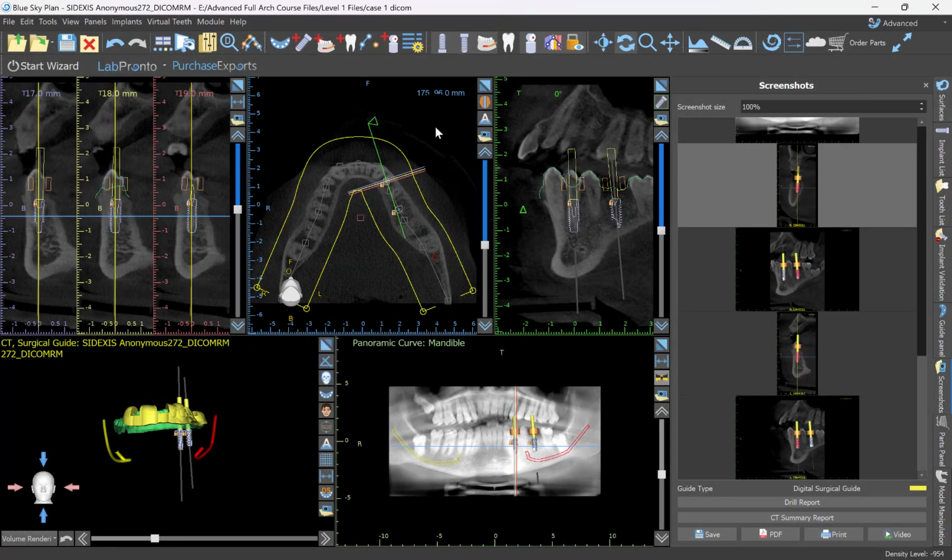And then the last thing that you always have to do, this is so critically important, is you've got to save your case. And I would even suggest, if it's early on in your planning, if I was really doing this case, it would take me 5 minutes, and I've not lost that much if my computer dies or it crashes or something like that. But early on, there's nothing more sickening than working and spending all this time trying to learn this, and then your computer crashes and you lose it all. So just periodically save your case.